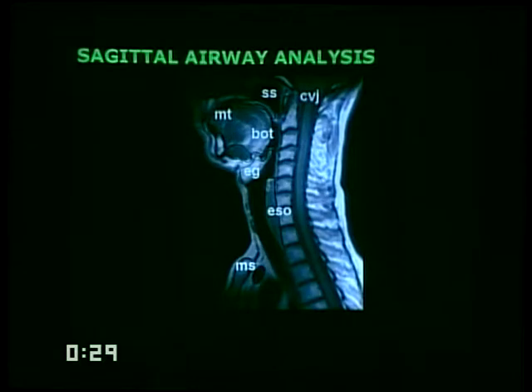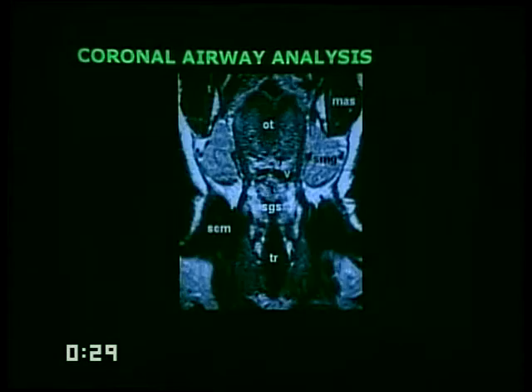This is not a cervical spine MRI study, so you're not really assessing the cord in any great detail, because your field of view is much larger than the field you would use for a cervical spine MRI. Once you've assessed the rigid tube, you want to assess the upper part of the airway. The airway has no mobile protons, so all you see is signal void. The sagittal sequences are the best suited for assessing the airway. If the airway is not patent, you have to stop looking at other structures and find out what's going on. This could be a surgical emergency if there is near total or total occlusion of the upper part of the airway. The airway may also be assessed in the coronal plane.